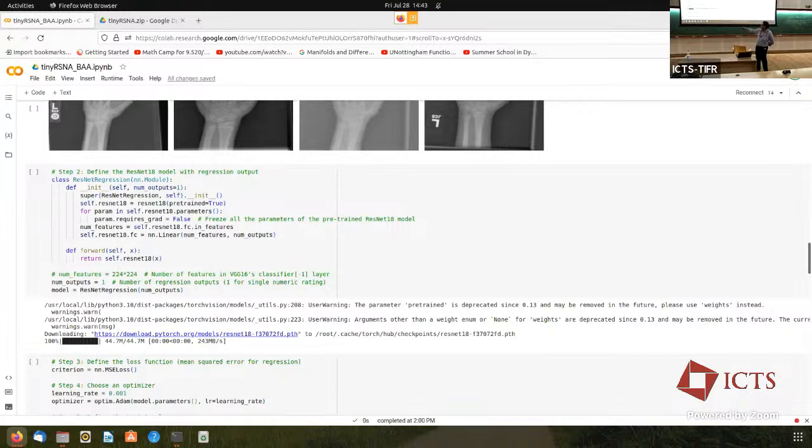So this is actually saying the last layer is called FC, fully connected, right? So it's a good exercise to try and figure out how these names are. I can always tell it to you, but it's good for you to figure it out on your own. You can always ask ChatGPT to show you, or you don't have to go to ChatGPT. Inside Python code, you can ask it to describe the entire network for you. And then you will see what the last layer is called. There's a name attached to it. That name is FC. So you can change that layer, wipe that layer, rewrite a new linearly connected layer. Does everyone get what I'm saying?